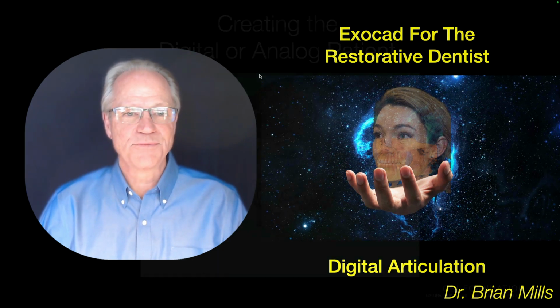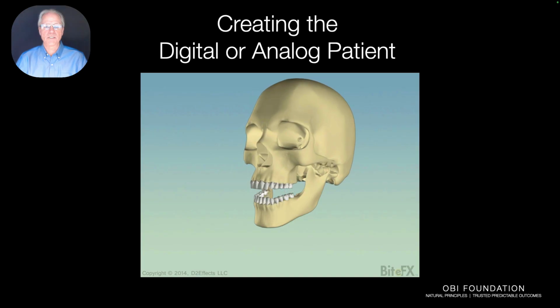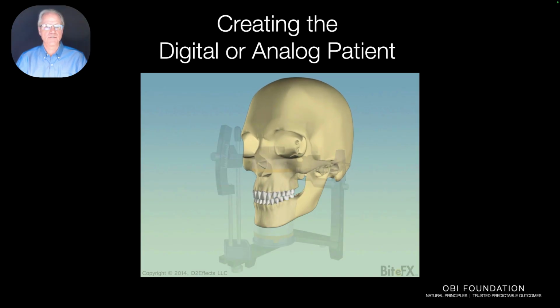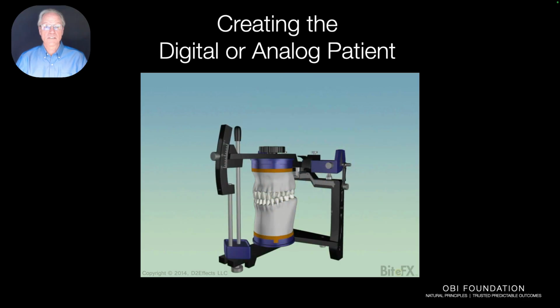So let's get started. One of the critical things when you're doing comprehensive care for your patient is to have accurately mounted models, and you can do that in the digital world or the analog world. What you'll find when we're done is that it's much easier and as accurate, if at times not more accurate, than doing an analog mounting.